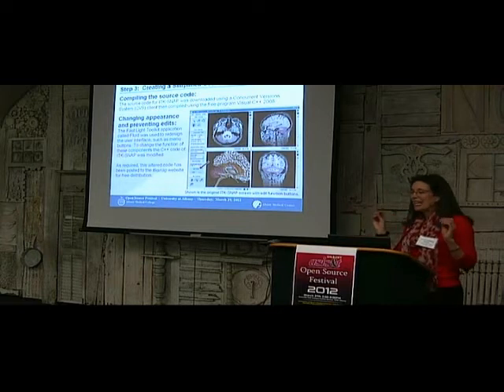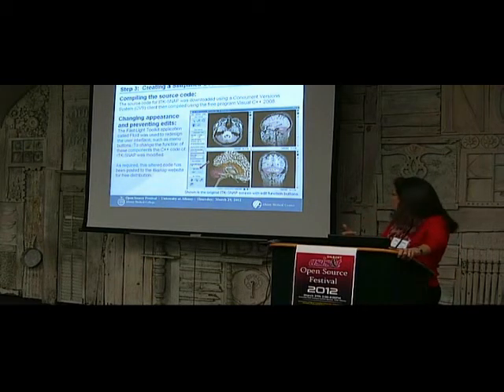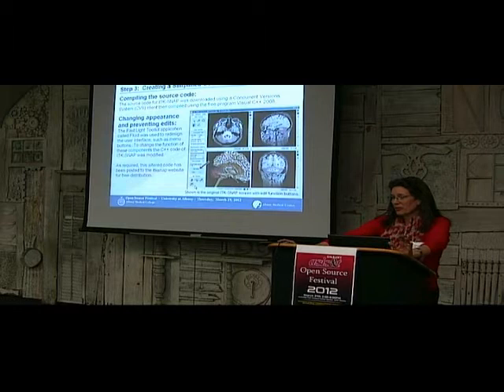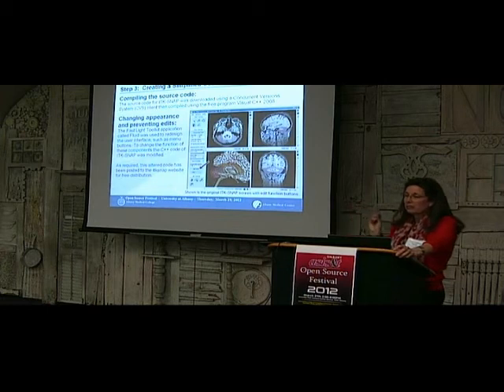But this wasn't the end, because as I hope you can see from this picture, this is the main screen on ITK Snap. And all of these options on the left are editing tools. Well, when we first ran this for our medical students, they started editing all the database, and they were making a mess, and it was really frustrating. So we realized very quickly that if this was really going to be a useful tool, we had to create a simplified user interface that prevented them from editing any of the database.